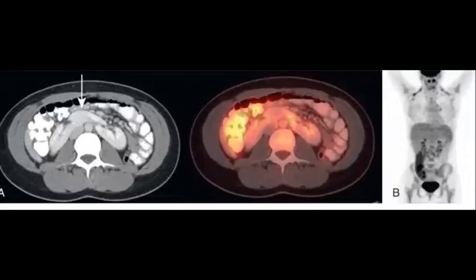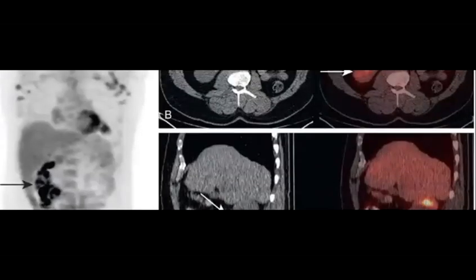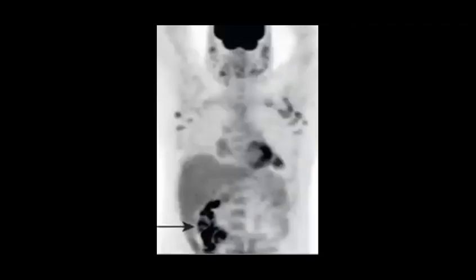So yes, horseshoe kidney, and you see the normal uptake of the kidneys. So don't miss it. In the MIP image, it sometimes gives you this. So this is an anomaly, horseshoe kidney, perfect. There is some uptake, which is physiological. If you find a lesion here, then you can talk about something, but you don't find one until now. I want to hide this, but okay, it shows you. I just want to show you the MIP.